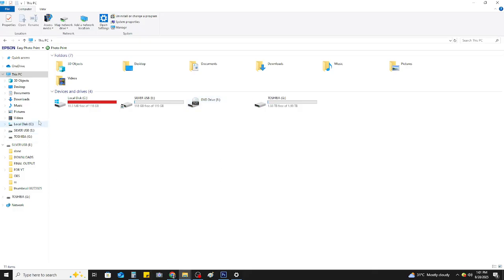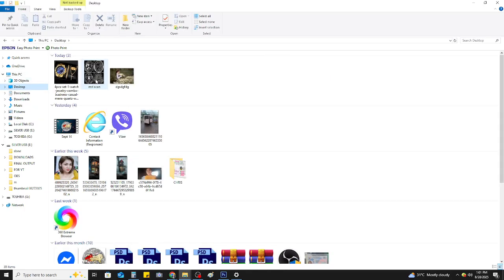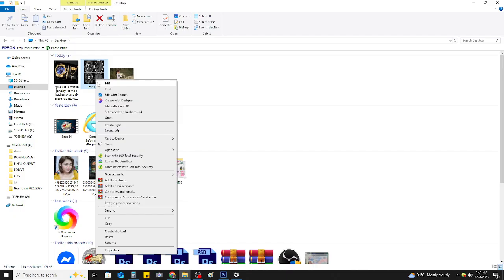This folder will contain the files you're looking for, typically with a .dcm extension, which is the standard format for DICOM files. While there might be a program on the DVD for viewing these files, the most crucial elements are the .dcm files themselves. Now, let's make sure these files are safely stored on your computer.